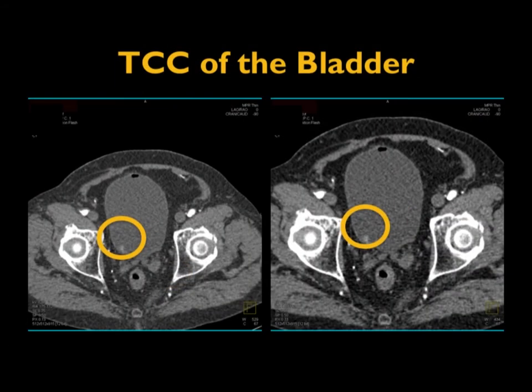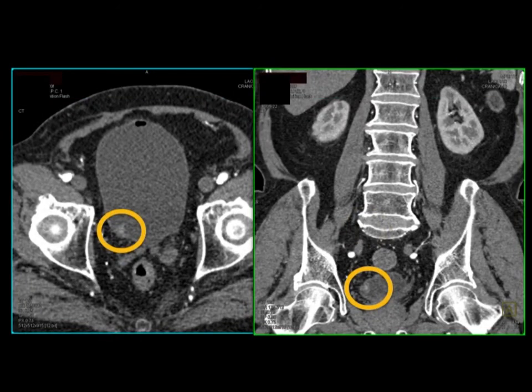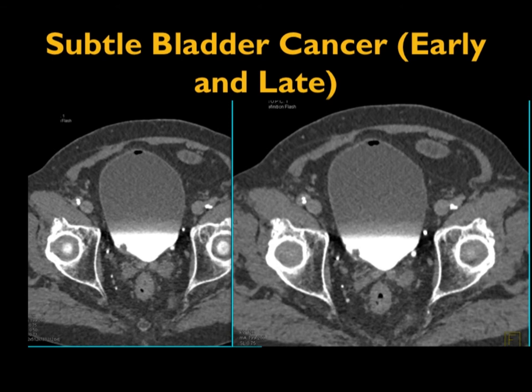Another patient, look at everything at about 7 o'clock. Small, under 1 centimeter enhancing lesion. Very nicely shown there. And here it is again, showing you it on the right side. And then here it is once you had contrast in the bladder. So sometimes bladder lesions will show better when there's positive contrast in place. Sometimes it will show better when there's water in place.